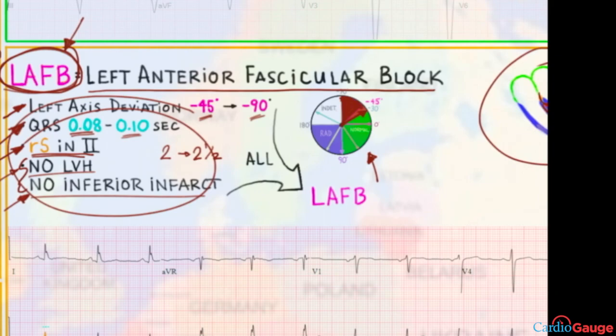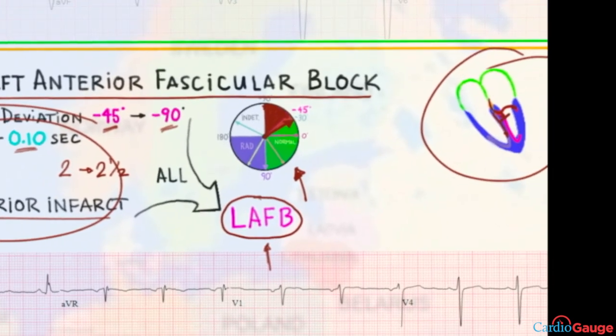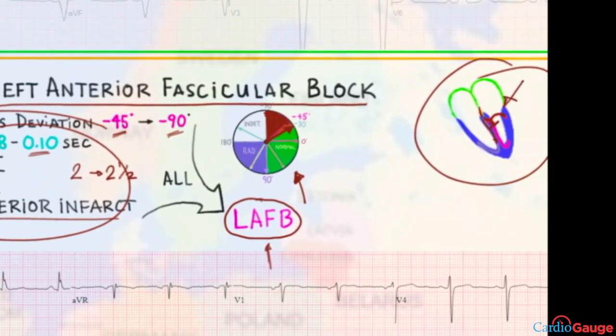This diagnosis used to bother me a lot as a student and as a resident. I didn't really see how it affected what we did with the patients, and that's played out in my career as an attending, that it's not too frequent that you make this diagnosis and then you learn something new about the patient. But anyway, it does indicate that there is some pathology of the conduction system over here, although it's not a very specific diagnosis. Let's look at an example.